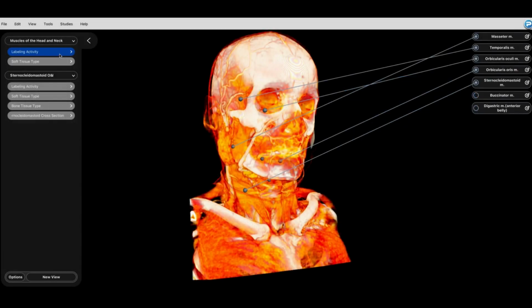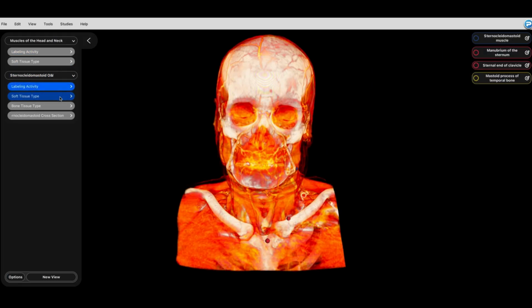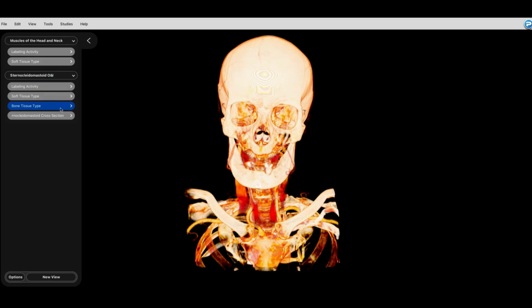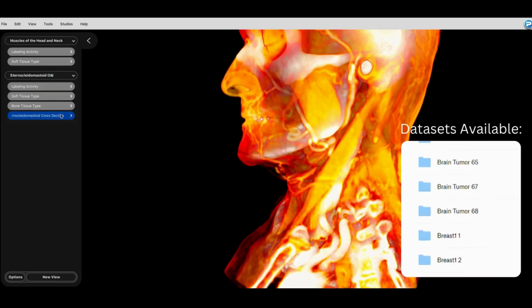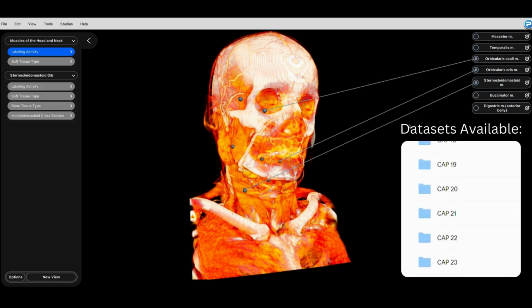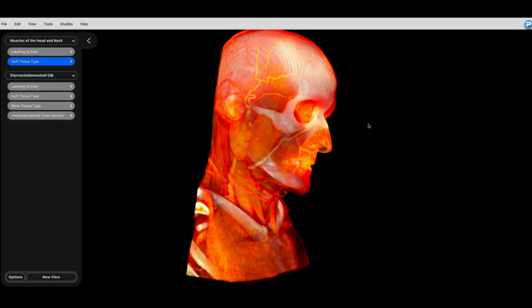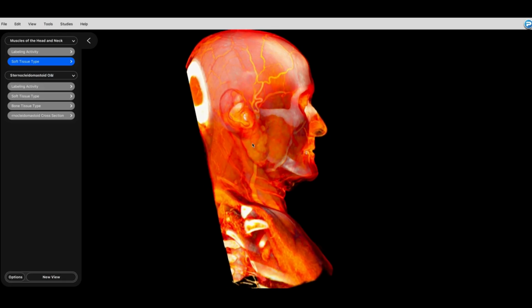Creating your own BodyViz file allows you to utilize any dataset and incorporate it into your classroom and curriculum. With hundreds of datasets available, the BodyViz library opens up many possibilities. In this video, we will be going through the steps towards creating your own BodyViz file from start to finish.